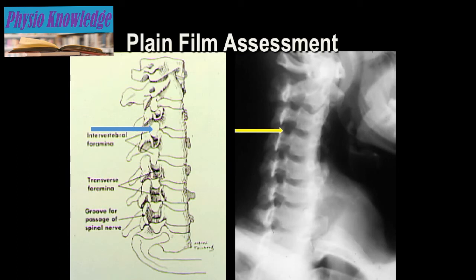In the event of a fracture or severe degenerative disease, then we could have some obliteration of this area and therefore suspect that some of the patient's symptoms, in case you have neuropathic symptoms, can be coming from this region. On the left, again, is a schematic, and we're really representing the same thing, the neural foramina from the cervical spine.